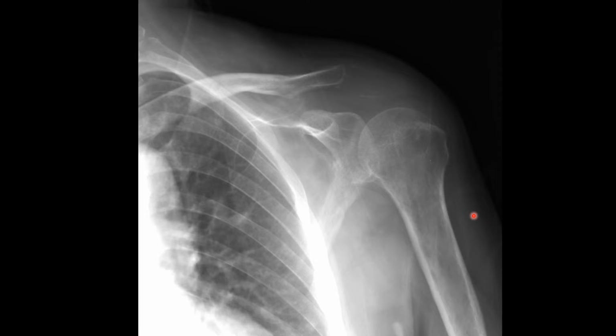And as we zoom back out, you should continue your assessment, looking around for other areas of skeletal involvement, assessing the area of lytic destruction. There seems to be some type of soft tissue mass which coincides with the patient's clinical presentation, but I don't see any obvious evidence of a periosteal reaction or, again, other areas of skeletal involvement. Some questionable areas of lucency in the proximal humerus, but otherwise, besides this lytic destruction of the acromion, that's all I see on this image.